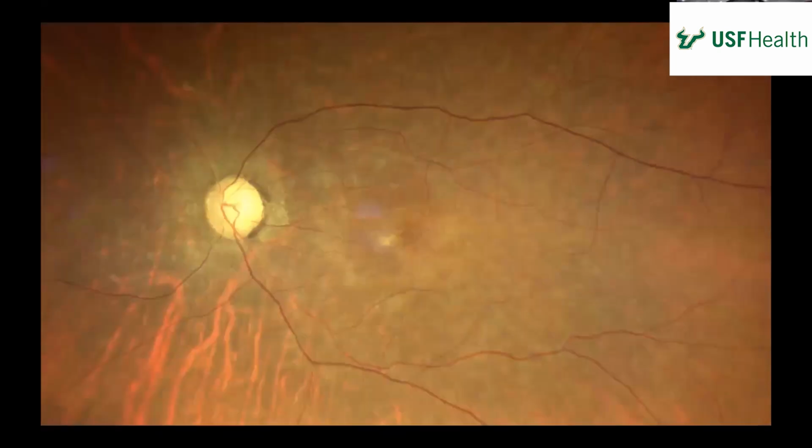And so, fundus photo of the left eye. The media appears clear. It looks like loss of some of the vasculature, especially in the nasal portion of the retina in general. It looks mildly tortuous in the remaining temporal portions.